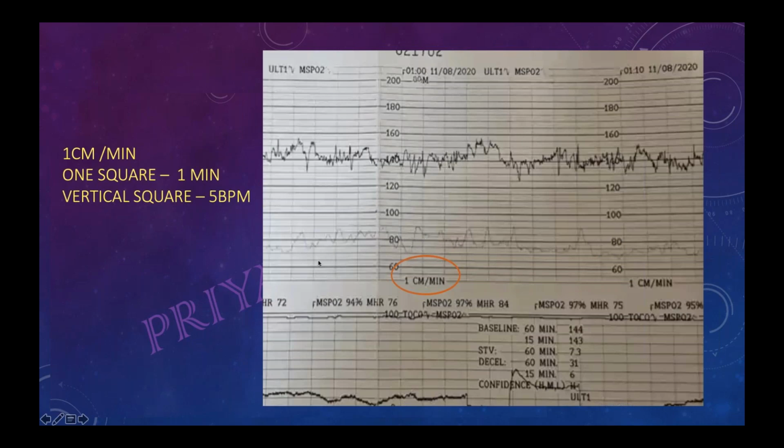Again, they will be marking, because I have taken a very small piece of CTG paper. I never had a big one. I just wanted to show you this much. But this is maternal pulse, because 80 can be maternal pulse.